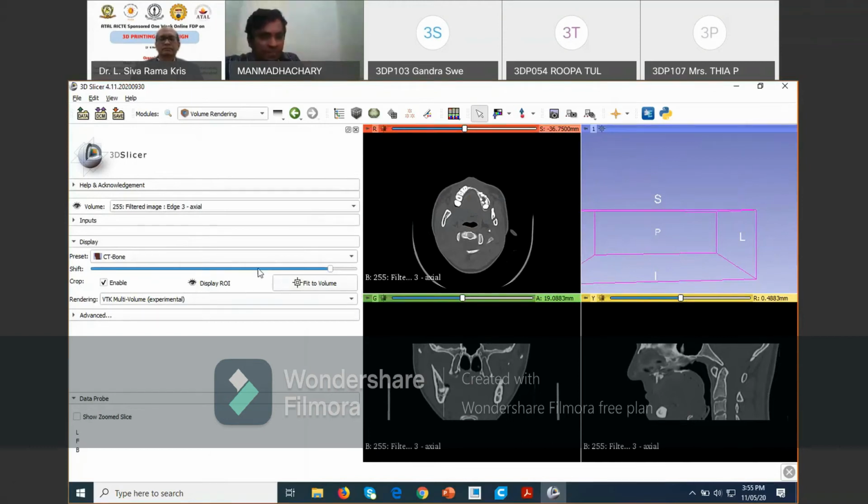Sir, one more question I would like to ask. Whenever we are shifting the cursor to the extreme, all the bones are getting disappeared. Why is this occurring? What is that action, madam? That is thresholding. Thresholding means we are selecting the very high density. Yesterday sir and I told them.